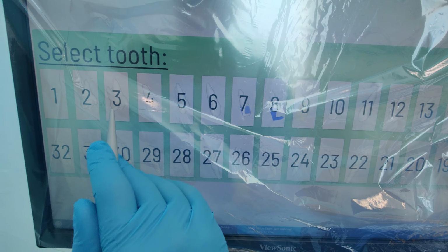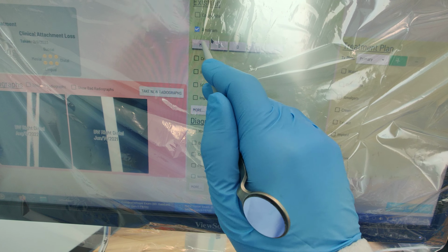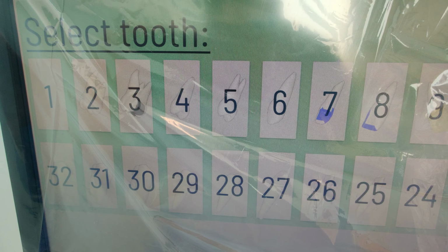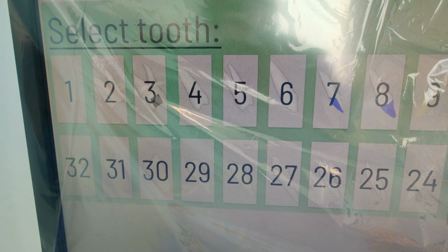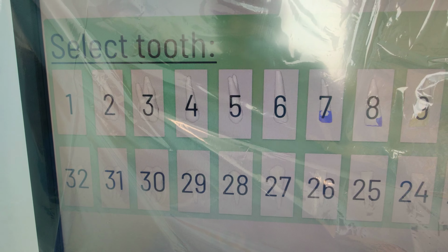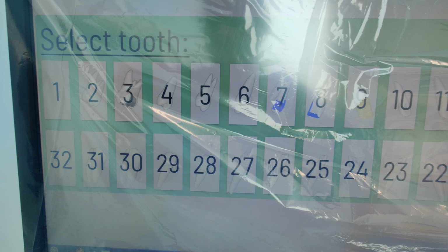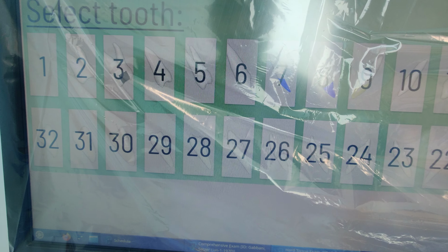Similarly, let's go with tooth number 3. Let's say there's an existing amalgam, MOD. So you can see this little hatching. When you see the hatching visual, that means it's amalgam. Similar idea as if you see it flashing, that means you treatment planned amalgam.